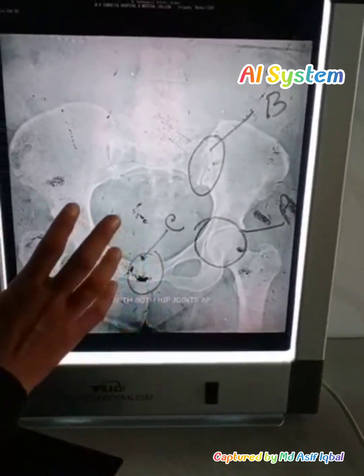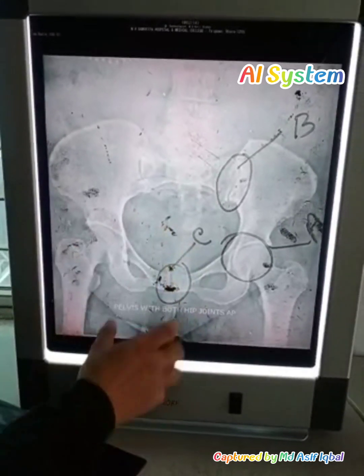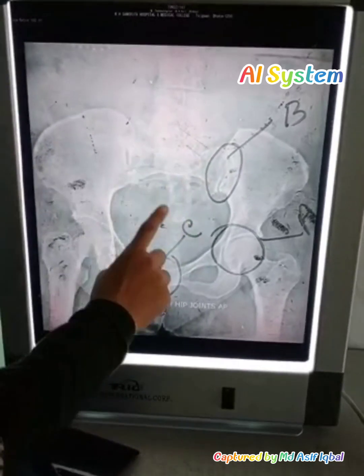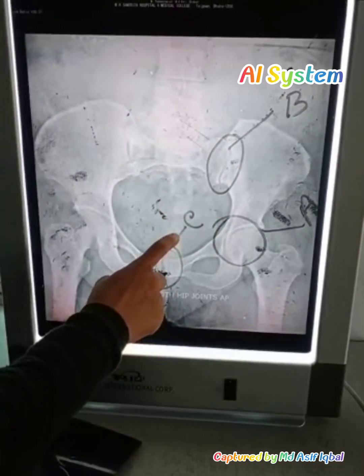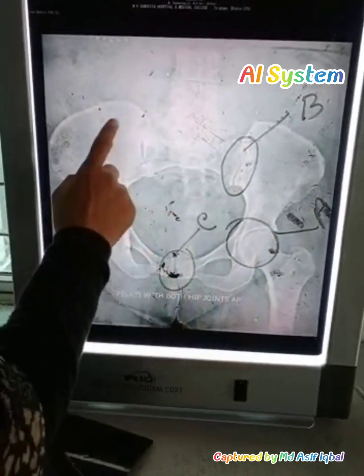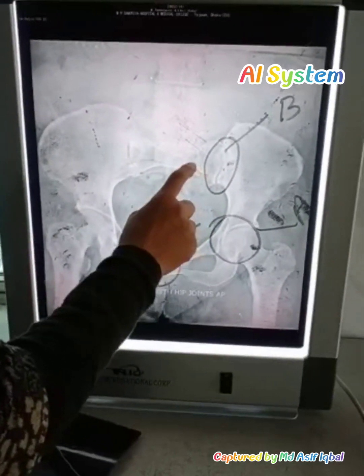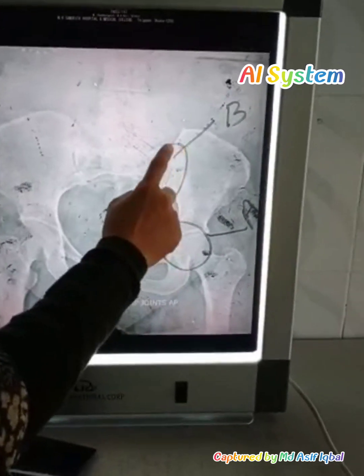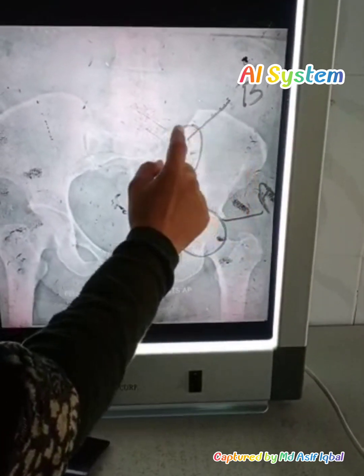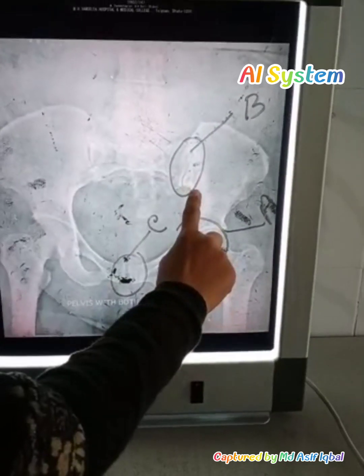Look at that, we can find out the impression of the hard and soft tissue structure. In the hard tissue structure, centrally the vertebral column is present, and that is the outline of the sacrum. Look at that, that is the coccyx, and this is the both sided hip bone. Okay, both sided hip bone. This is sacral promontory and ala of the sacrum. And what is this? Look at that, there is presence of an outline, that is sacroiliac joint. Okay, sacroiliac joint.